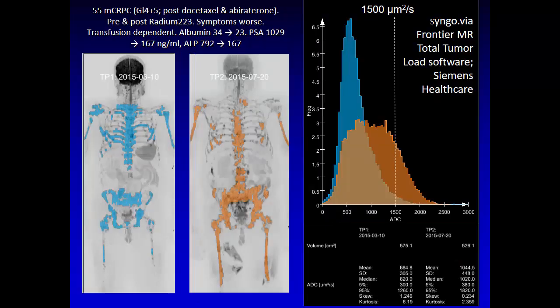But what about the bones? Well, look at the histogram. You think, that's interesting. So I've shown you this pattern. This is the third time I've shown you this pattern. This must be a response. So the patient is not only progressing, but is also responding. Both things are happening at the same time. Right? Now, that's not even the interesting thing.